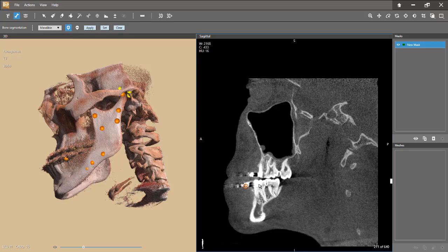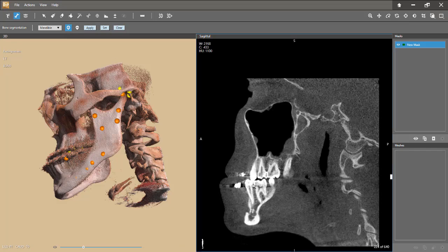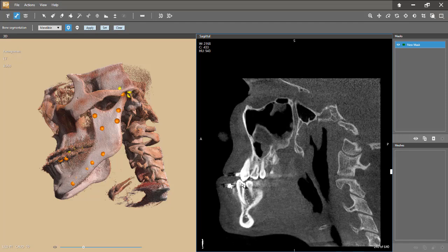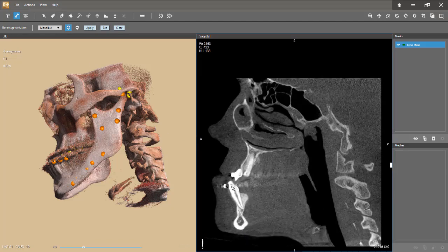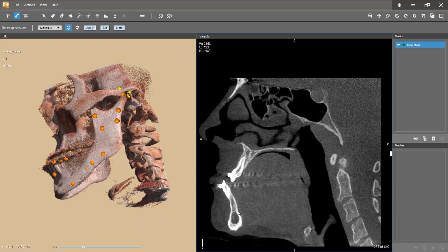Some plus again. Just before the contact, I will put a minus here. Plus, plus, plus, plus. And I'm just following all the path by putting some plus and minus all along. Plus, plus, plus. No contact, so no problem. Plus.